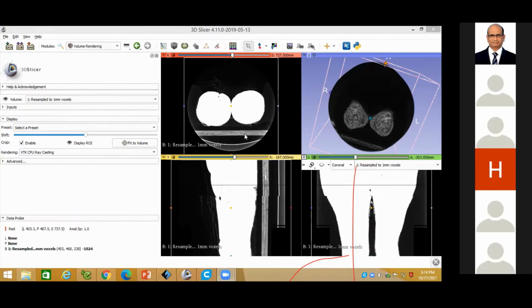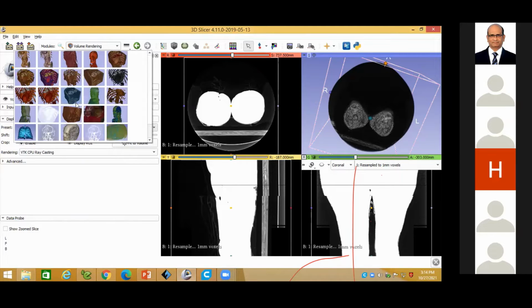Okay, sorry. Here, if you want the CT chest, you can choose this one. But whatever the tissue is required, based on the tissue you have to choose the different values, different bony parts here. Next, if you want the coronary, you can choose this coronary, and if only fatty tissue is required, you can select that. If you want only CT soft tissue, you can choose. If you want only the nerves, that also you can choose.